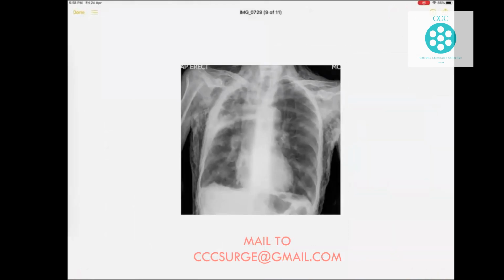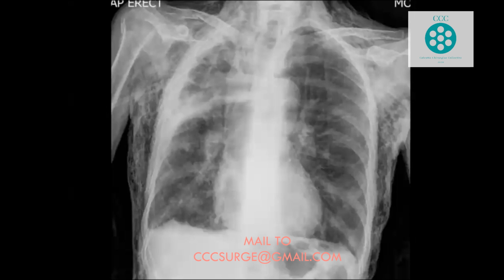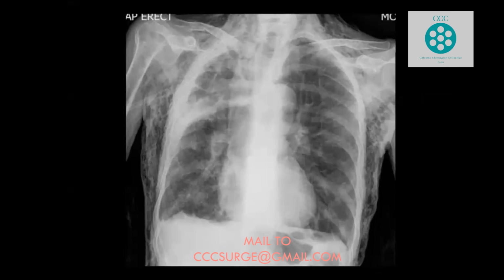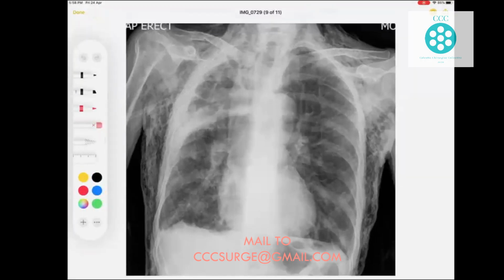Now see this one. This patient, now very quickly, let me see if I can have my pencil, please. First of all, this patient does not have a PA view. I think you have noted that. This is an AP view, that means anteroposterior, which was taken. Now let me see how quickly you can find out the bad things in that.